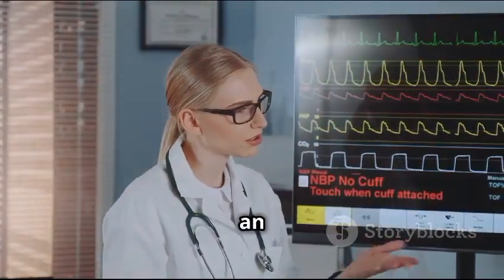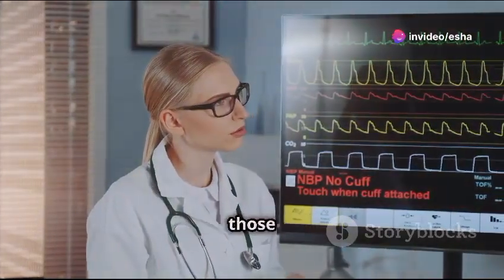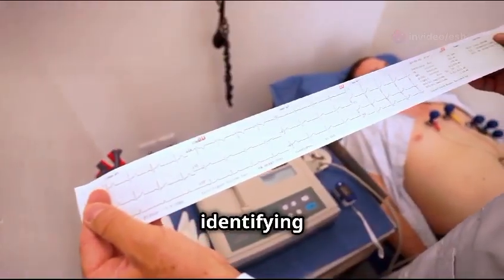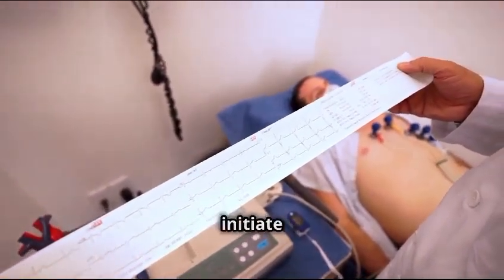Understanding how to interpret an ECG is essential for healthcare professionals, particularly those working in emergency medicine, cardiology, and critical care. By quickly identifying abnormalities, clinicians can make timely diagnoses and initiate life-saving treatments.